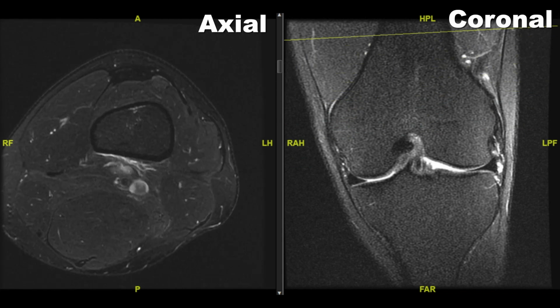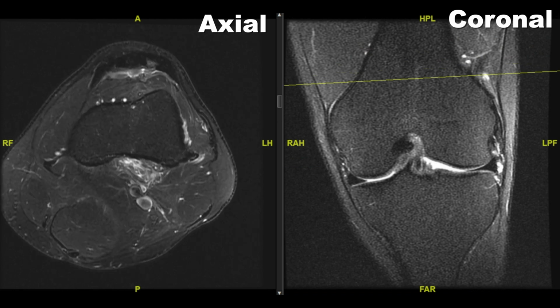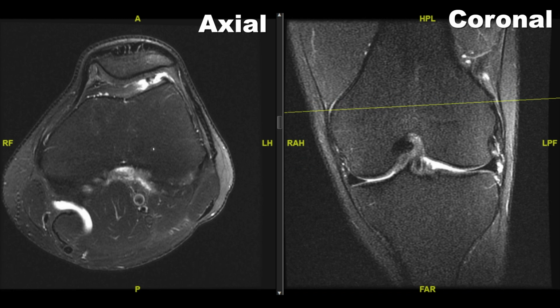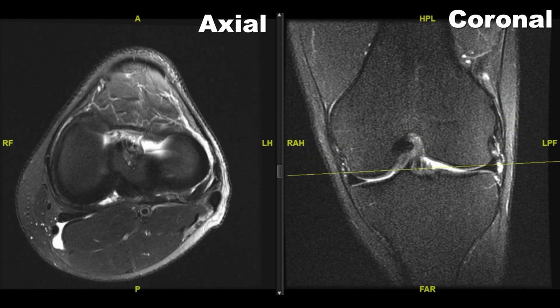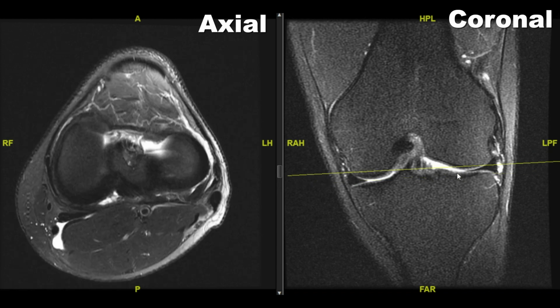And so this is higher up on the knee, right where the thigh bone starts to flare out into the knee joint part of the thigh bone. And we'll move that yellow line down. And so you can see on the left image how the knee actually looks as we start moving down, making cuts across that yellow line. And so you can see right when we get to this yellow line, right about to the joint, right here, you can see this is the best we can do. The yellow line kind of jumps up and down.